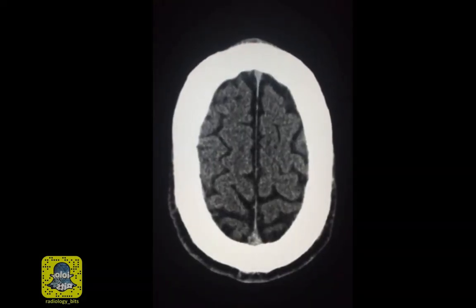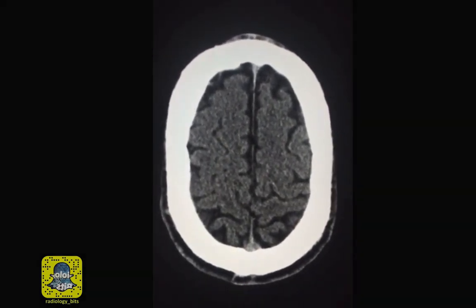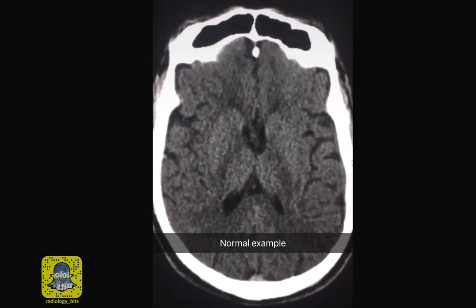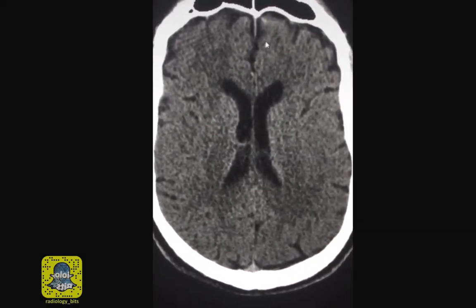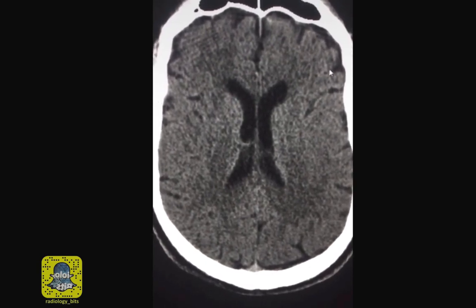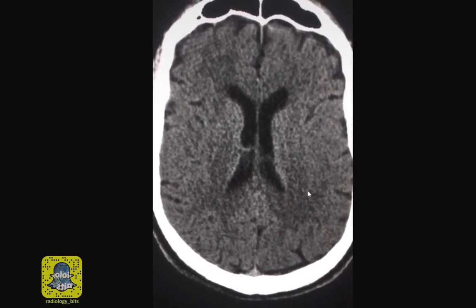Seniors may have noticed the abnormality, but I'll go a little bit over some normal structures before we proceed so juniors could follow. So this is a normal adult brain. This is a different normal patient. As we discussed before, the gray matter on a CT scan of the brain looks a little bit whitish, while the deeper white matter looks darkish. So it's the opposite of what you think.